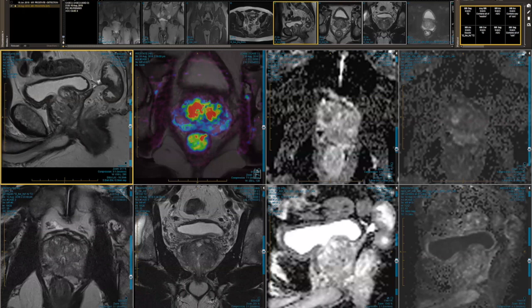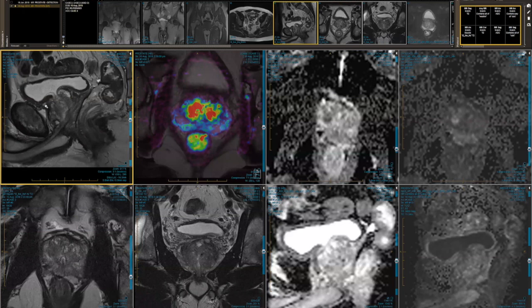This is case 2. Prostate volume is 40 cc. Again, I'll just link the... So again, we've got the sagittals, the 3-plane T2s, the 2-plane diffusion, and the colour. Sorry, Richard, I've jumped the gun. Let me just give you a quick intro from a clinical perspective.